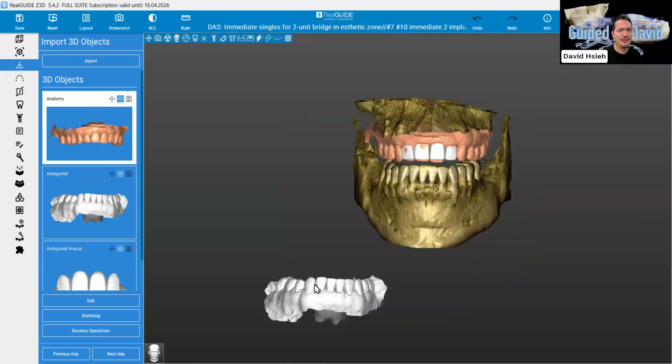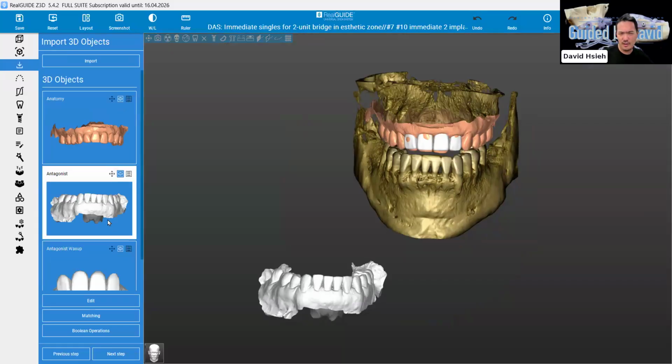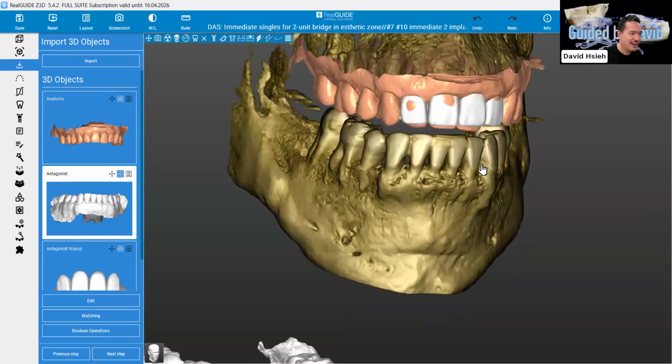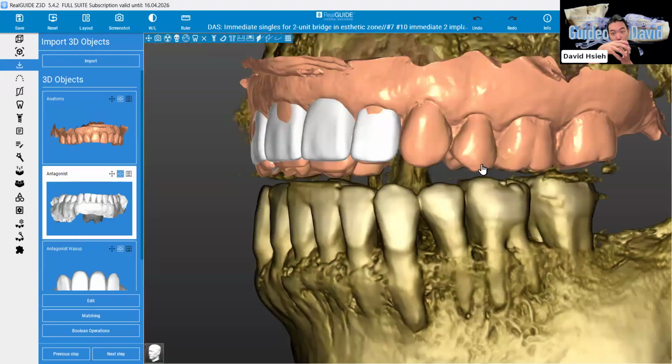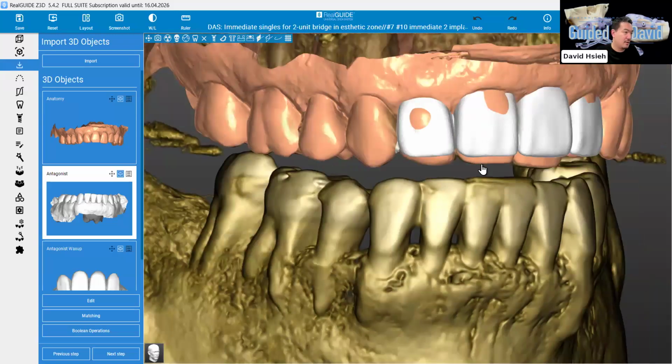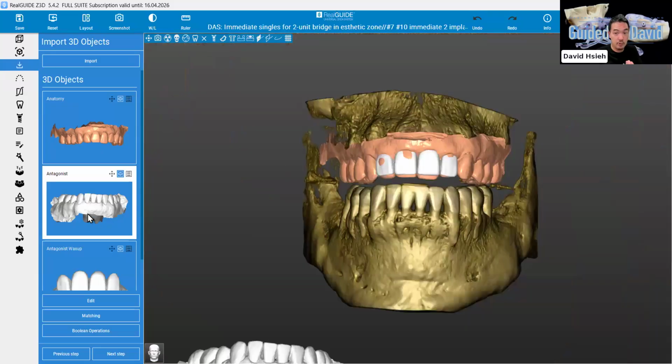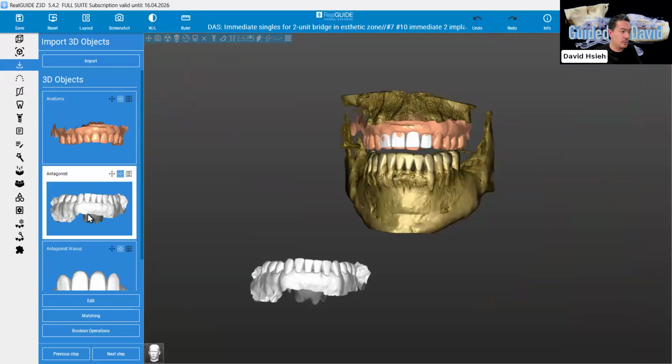So you say, what about the bite, right? No worries. When people do the merge, you can see on a CT scan the bite is open, right? Usually when the patient takes a CT scan, you have to open the bite to bite on a stick or something. And actually this is a better way to do it, because the contour of the crown is so easy to merge to, compared to when the patient occludes, when you cannot see it that clearly. Because we're going to do the upper design right now, we don't merge the model to the lower arch, because the bite is not a bite. So we need to keep the same bite, right?